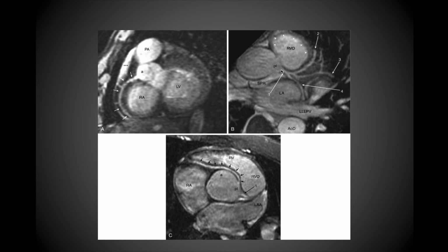And then right here we have the left main coronary artery. Now, it can be a little bit difficult to discern exactly what you're looking at in terms of the branches, but effectively what we have here is a marginal branch coming down right here, labeled number 3. This is going to be the LAD, the left anterior descending, or the anterior interventricular, labeled number 2. The way to tell that is, remember that has to run around anteriorly, and it's going to run in between the right and left ventricles.